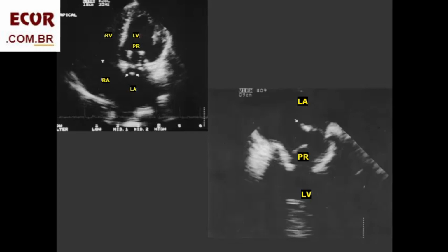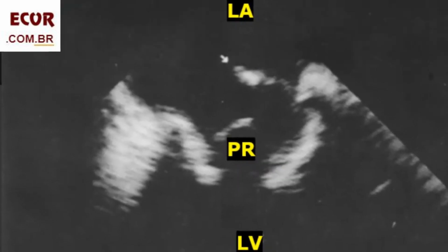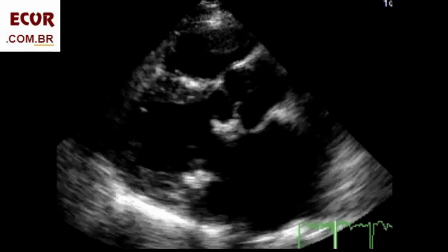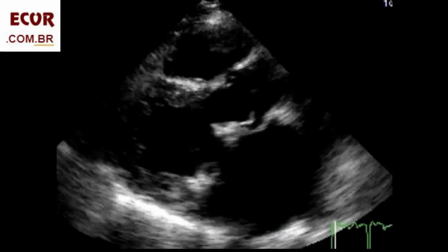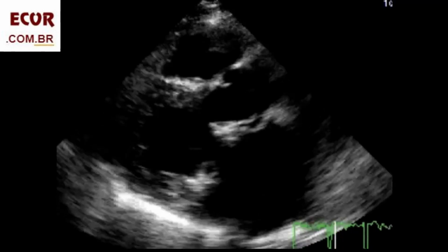The diagnosis usually is easy by demonstration of the leaflet moving beyond the plane of the ring. That can be seen in a transthoracic echo, but is much better evident in a transesophageal, when we demonstrate a leaflet tip going behind the ring further into the left atrium and pointing to the atrial cavity. Here there is obvious rupture of one leaflet of this bioprosthesis in mitral position.